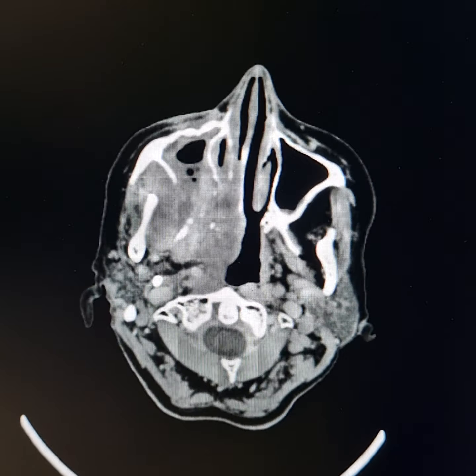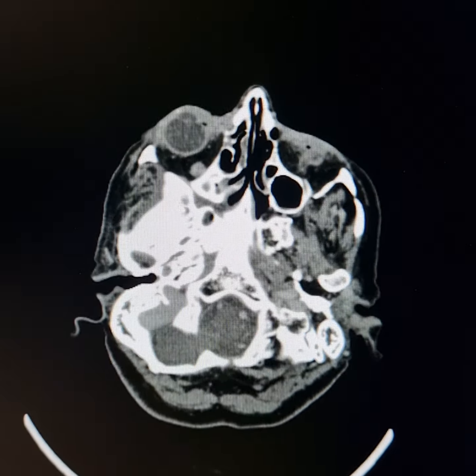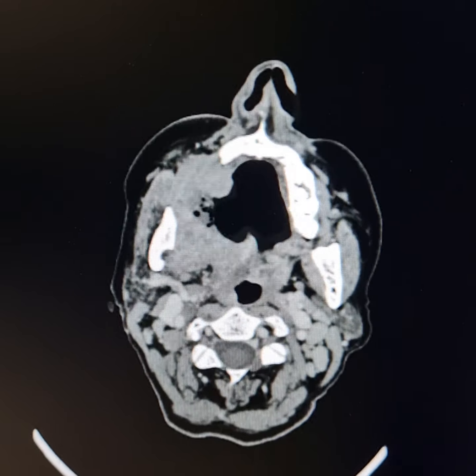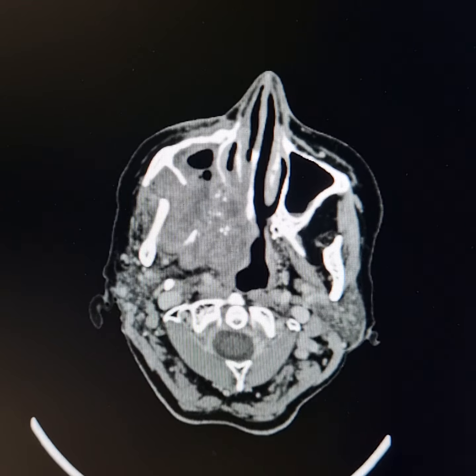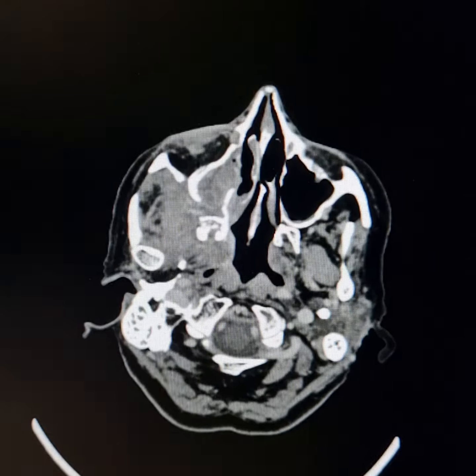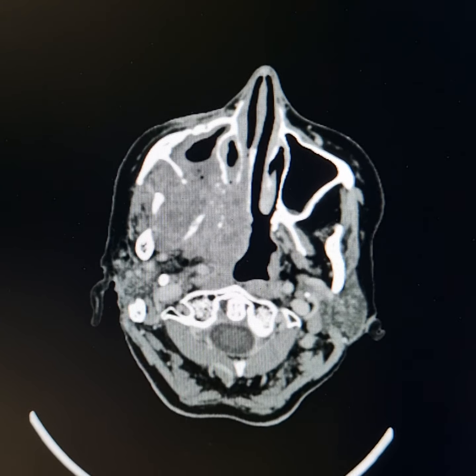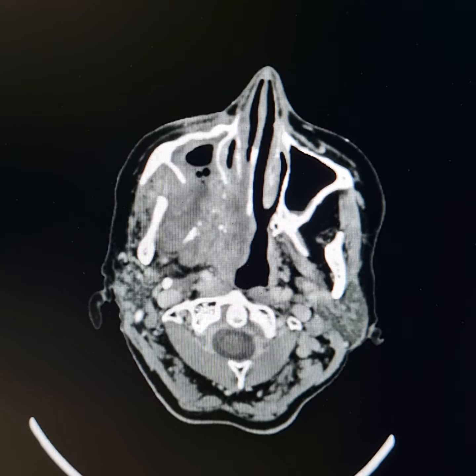So there are two ways of explaining such lesions. Number one is that we explain the mass lesion first, and number two, make out the details of the eroded bone. The second method of explanation is that we enumerate the eroded bones first and then the extent of the soft tissue mass. I prefer narrating it in a way that the soft tissue mass is explained first in such a way that there is no lag.